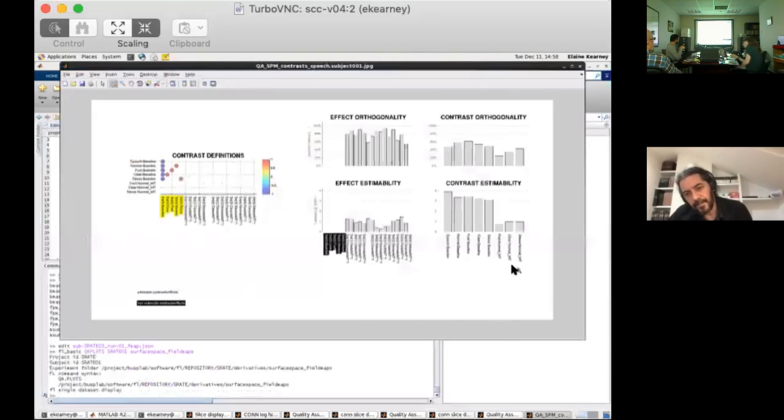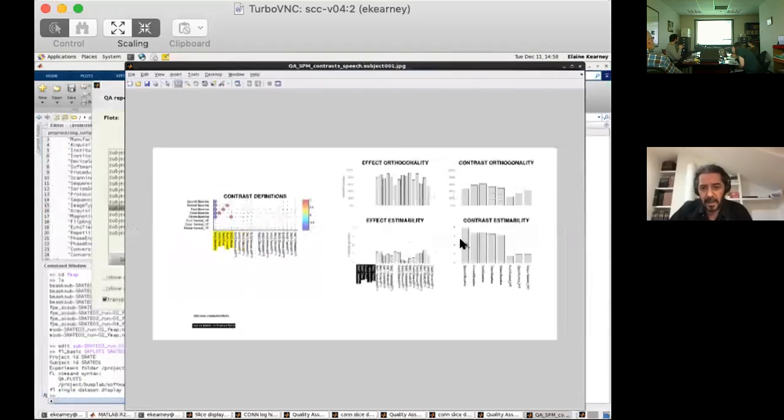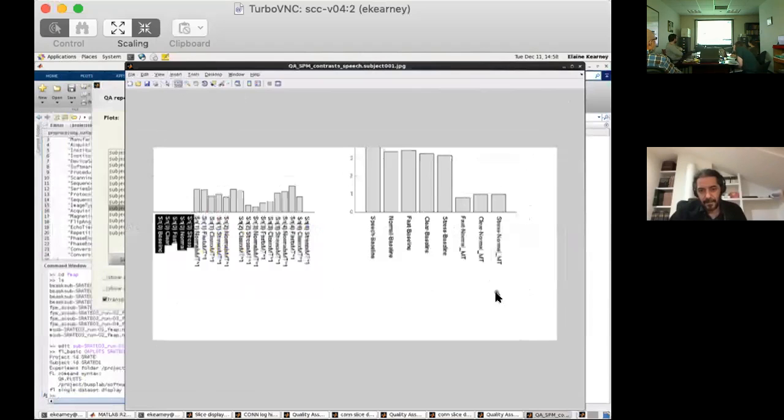I'm also having a hard time seeing it. Yeah, sorry. This plot is always, for some reason, low resolution. Oh, well, this is just because it's showing in a MATLAB window, right? You can just zoom in on that. If you just zoom in, you should be able to see it in high resolution. Perhaps. Yeah. But so this is stress minus normal, clear minus normal, and fast minus normal.